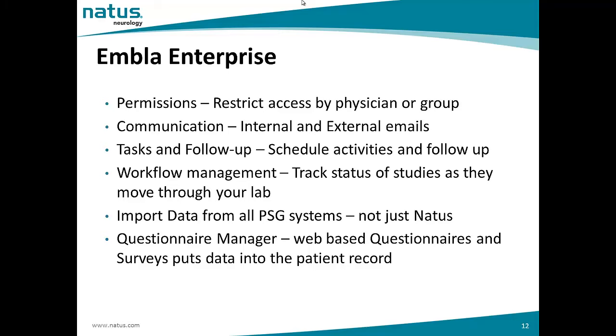With all the reports that have been generated from the respective systems, we can customize an IntelliSense module for each and every one of the reports, so that Enterprise can scan these reports and transfer all the clinical outcomes into the database. Please note that Enterprise does not keep raw data. It only keeps the clinical parameters and clinical outcomes.